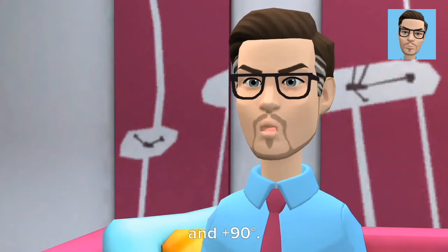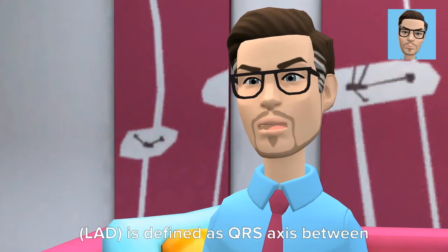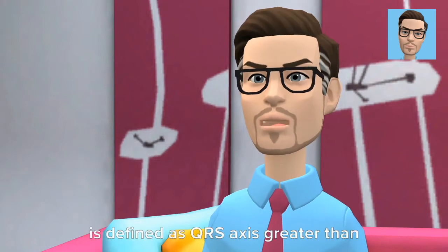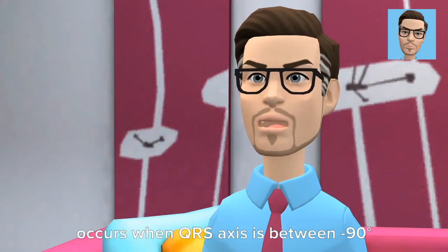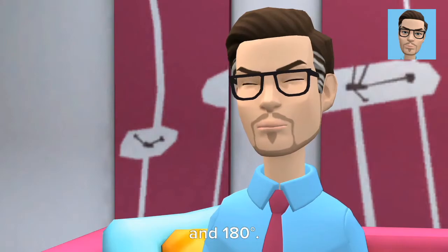In contrast to that, left axis deviation (LAD) is defined as QRS axis between -30 degrees and -90 degrees, and right axis deviation is defined as QRS axis greater than +90 degrees, while extreme axis deviation occurs when QRS axis is between -90 degrees and 180 degrees.